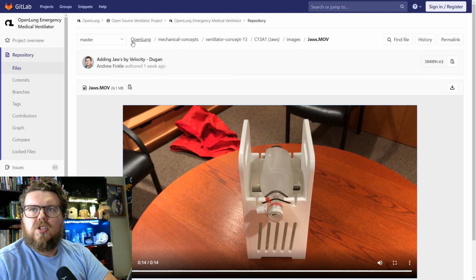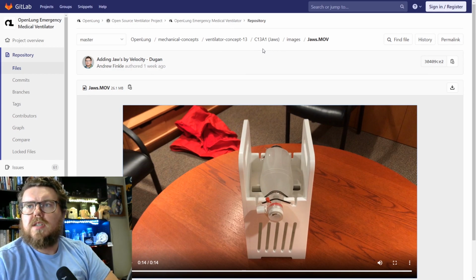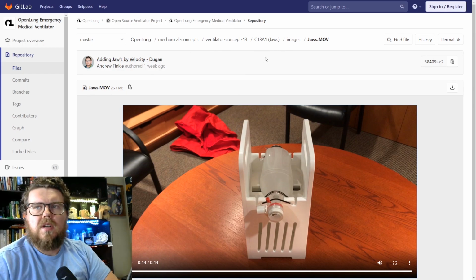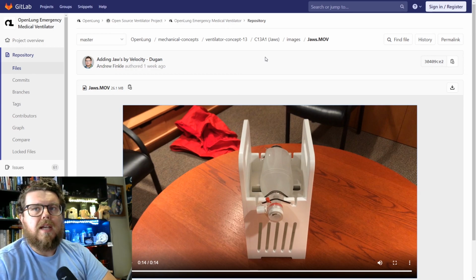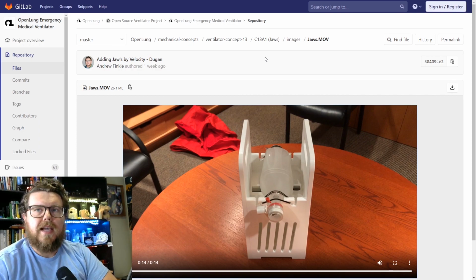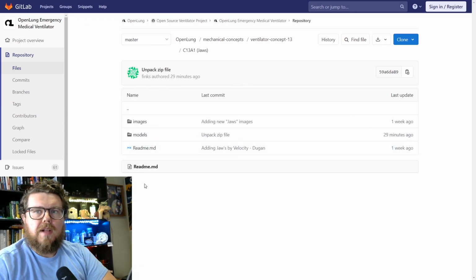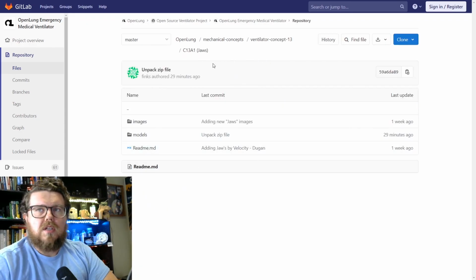Today I showed you quickly how the directories within a project work, how you can take a look at some of the design concepts being formed under the OpenLung ventilator project, and how you can access these files yourself, play around with them, modify them, and upload them back up into the community. In a future video, I'll show you how to create an account and contribute your own designs and your own feedback. Perhaps if you're a writer, you can help develop the README for the new JAWS concept.